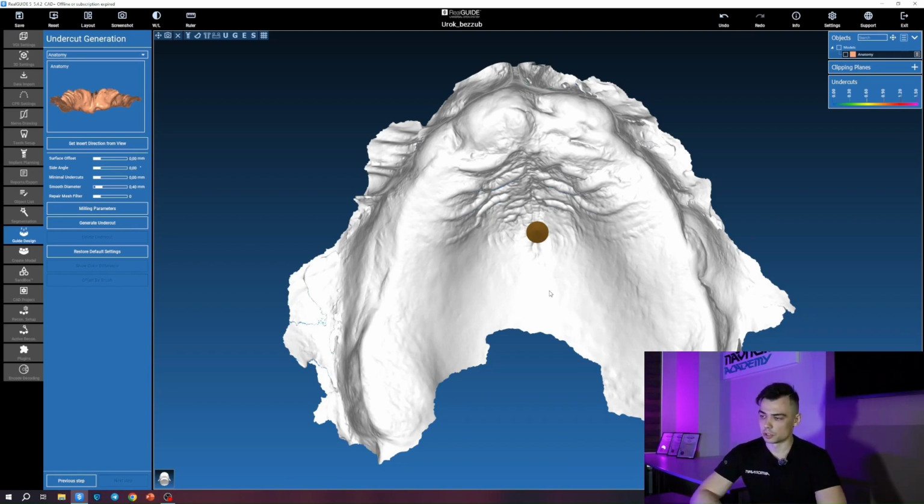We use a special principle, since we are now going to make this template based on the shape of the edentulous jaw. The inner surface of this radiopaque template will replicate the outer contour of the mucosa. This will be very useful to us in the subsequent stages when we need to align one with the other.